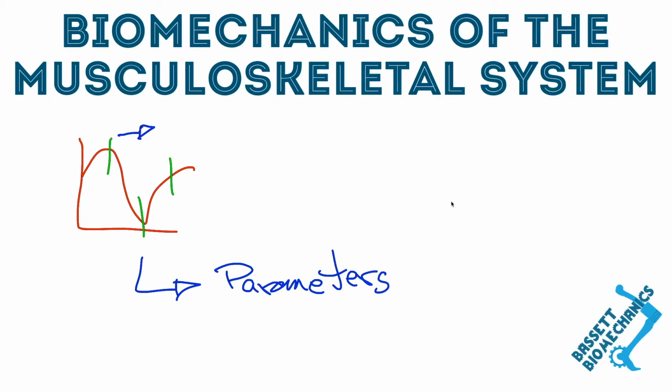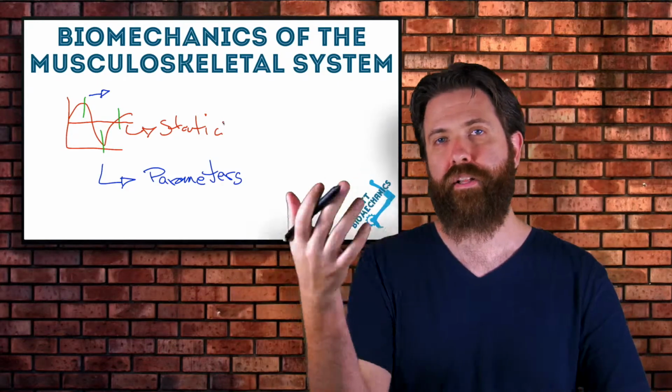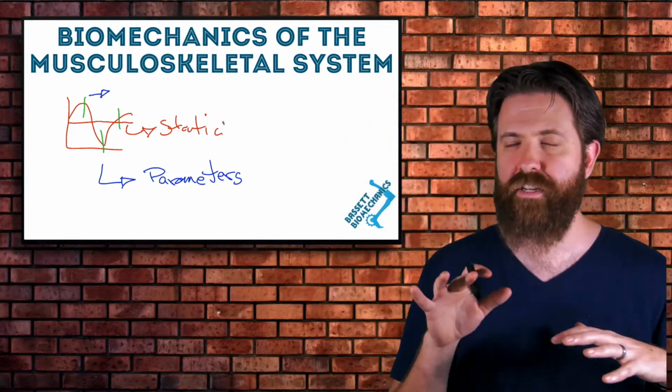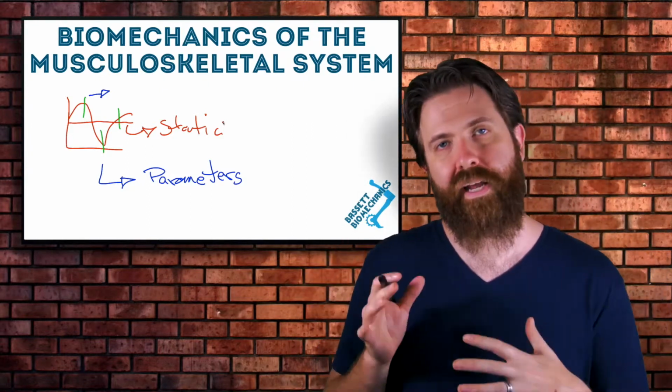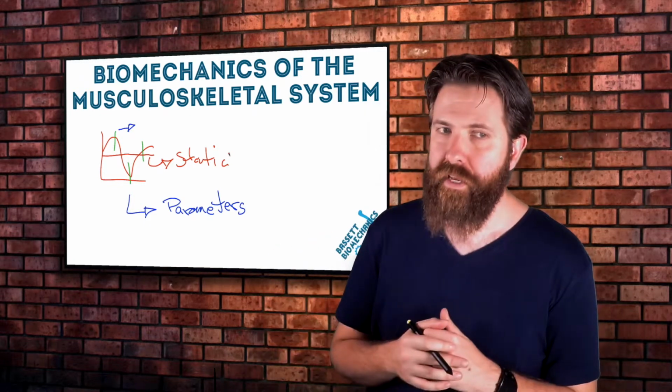Finally, in this unit, what we want to do is show you how to calculate static data. So on a graph, whatever the static angles, for example, the hip joint angle, you could put that directly on that same graph. Now, our focus isn't on how we're going to report data, but you know what? Having that static information in there is very helpful to a clinician.